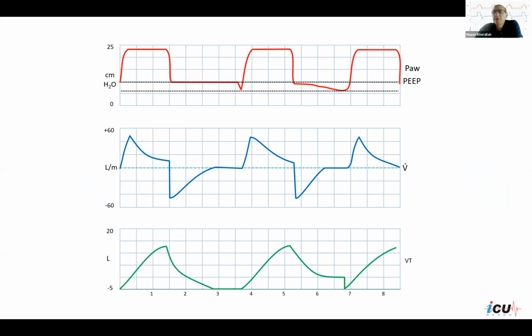And if you take a look on here, you will be able to appreciate that if we have a trigger level in the ventilator, this is a 0 pressure, and this is 10 centimeter of PEEP. And the trigger level is set at -4 centimeter of water. Now, this patient, he triggered the ventilator here. He decreased the pressure, reached the trigger level, and the ventilator is triggered.